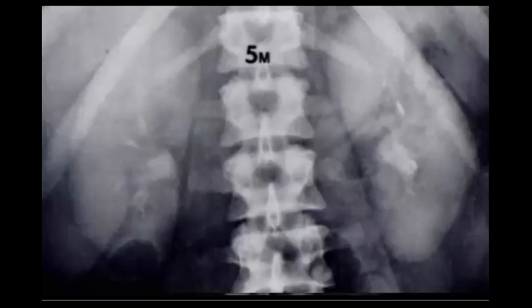Perfect. And if it's unilateral segmental, like it affects part of the kidney, not all, then maybe it is focal obstruction, focal infection, focal restriction, okay? That's nice.